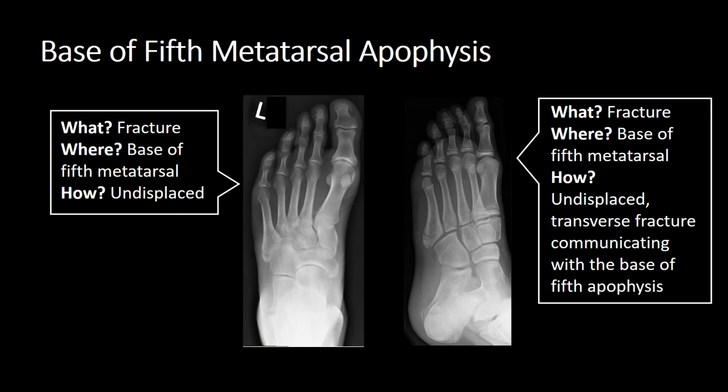In addition, there is an undisplaced transverse fracture that is located in the horizontal plane. So it's important to remember the apophysis runs vertically and fractures run horizontally.